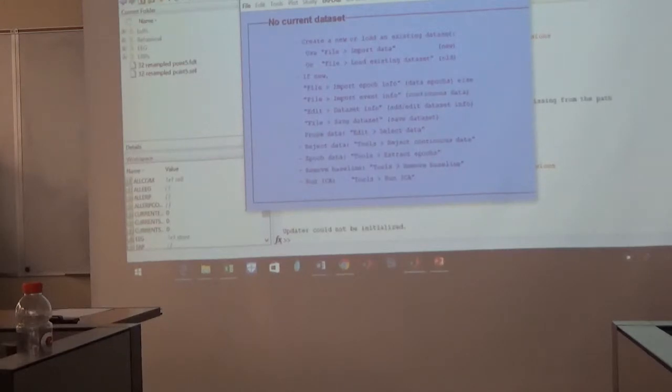So all you do is go to add subfolders, and you're going to navigate to wherever your EEGLab is. So go to your recycling bin and we'll restore that stuff. Okay, so you want to grab that and put it back. You want to first just put this back into Site 433X. And then you want to go into there.